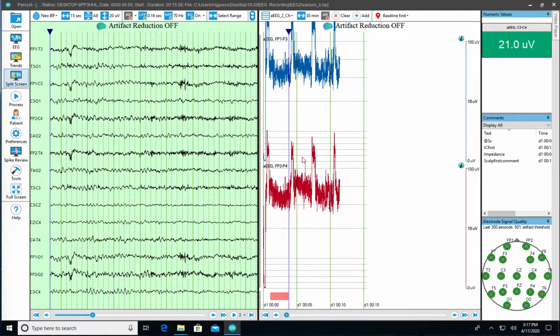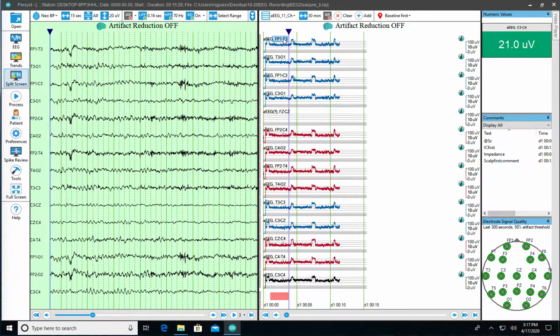Now, whenever we make modifications to a trend setup, it's a starting point. Then the conversation continues. This way, when we're talking with you about what to do with the trends next, we're starting from a nice point where a lot of it's done. You can see what's involved with creating these changes, and then you know, oh, well, I can have it be a different color. I can include different types of trends in that panel. I can have a default panel on this machine at the bedside, let's say, and I can have a different trend panel that I will use at the review station. You know, these are all valid things to do.